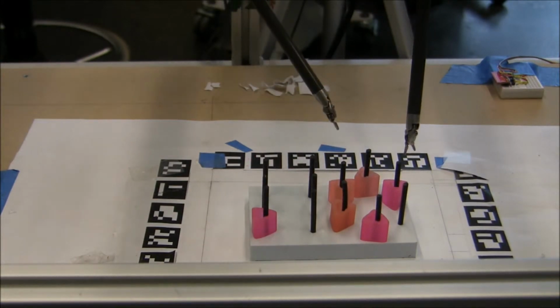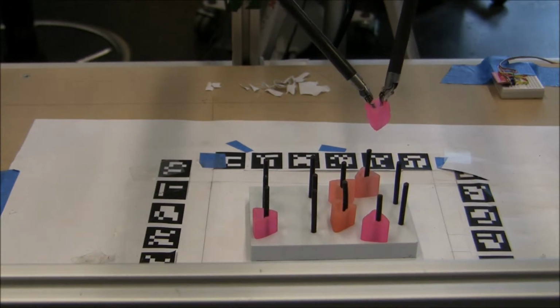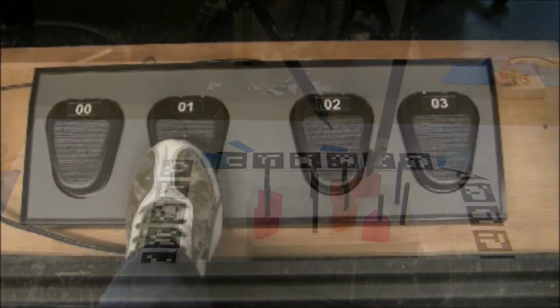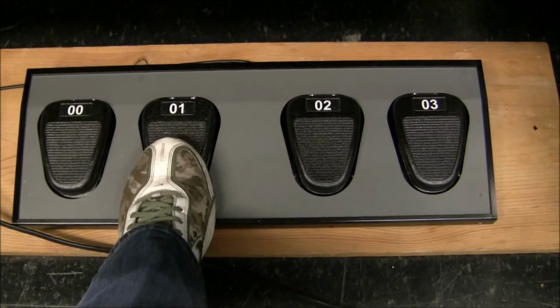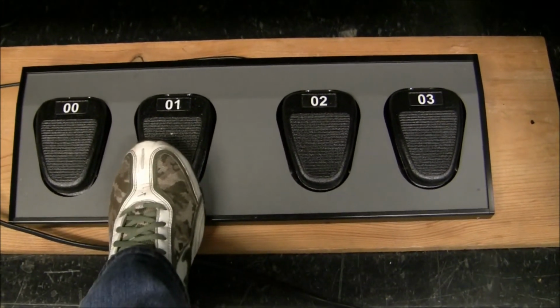If the surgeon reaches a point where his or her hands are not in a comfortable location, or are perhaps interfering with one another, the clutch function must be used. The clutch function is controlled by the footboard at the surgical console. While performing the surgical task, the surgeon must depress the pedal marked 0-1 while making all movements. The clutch function is activated by releasing the foot pedal.